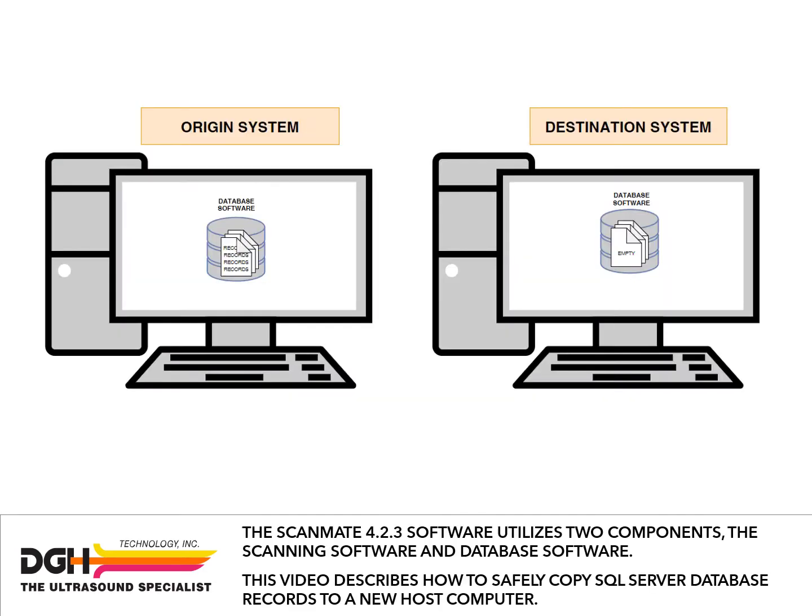The Scanmate 4.2.3 software utilizes two components, the scanning software and database software. This video describes how to safely copy SQL Server database records to a new host computer.